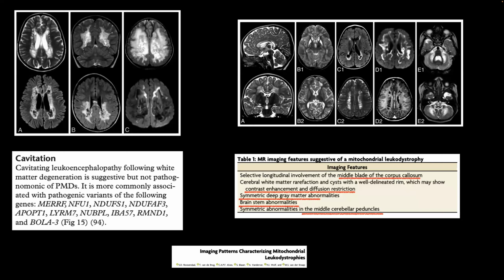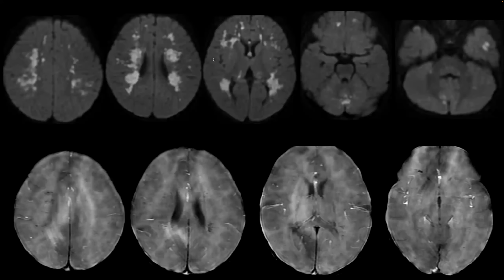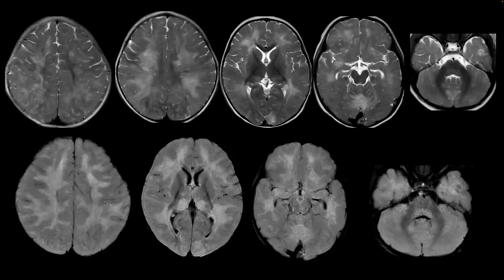I wouldn't entertain the possibility of vanishing white matter at all, because the diffusion changes in vanishing white matter are usually along the areas of spared rarefactive changes. So that is predominantly in the central white matter and the peripheral regions of the subcortical white matter rather than the periventricular and deep white matter. So the diffusion pattern itself does not fit vanishing white matter. And on the FLAIR also, there is no rarefaction demonstrated on imaging. So that possibility I wouldn't entertain at all.